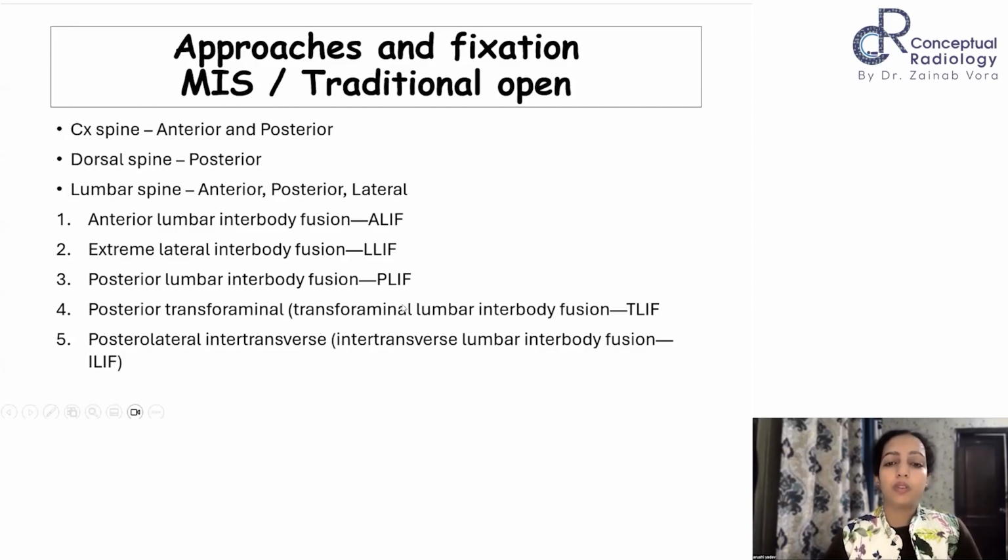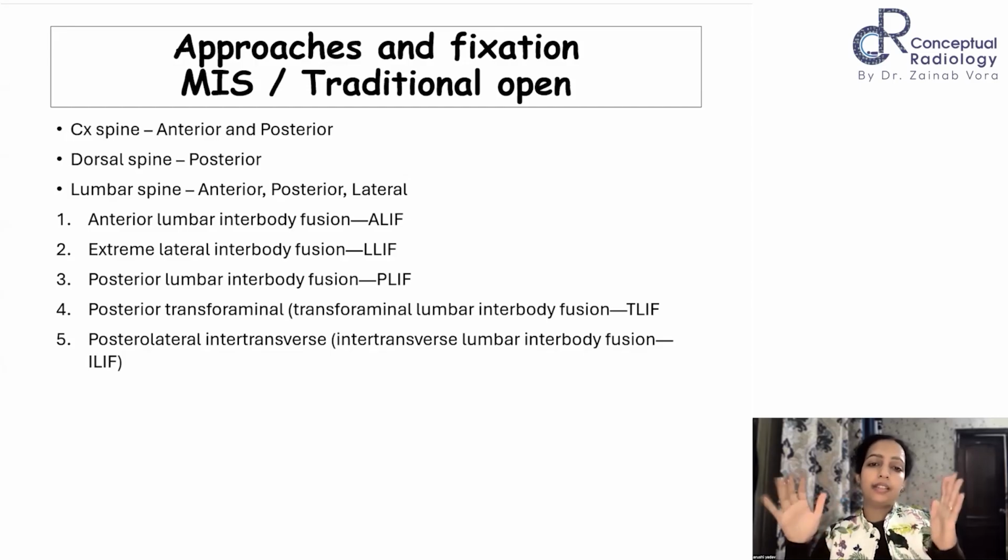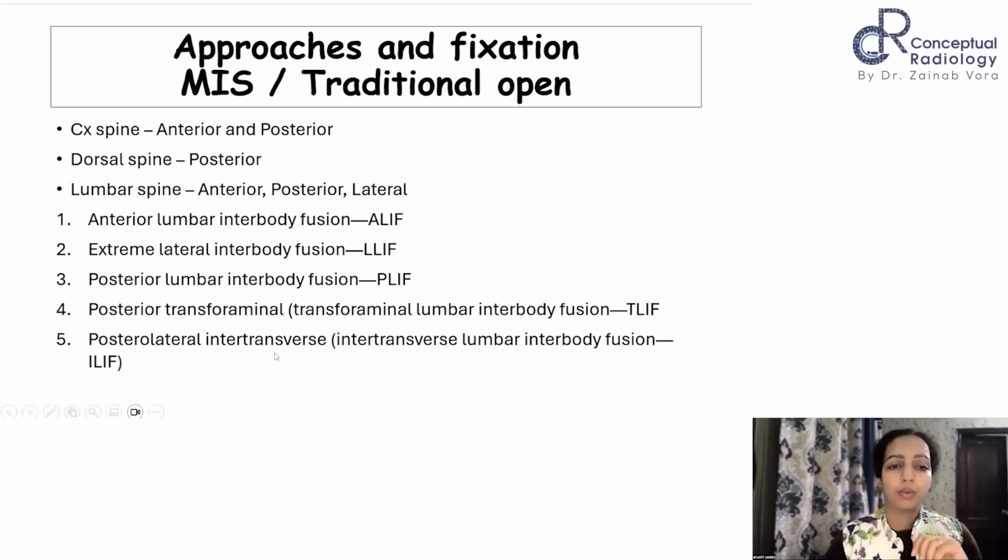And it goes by these names. These are all the names that you encounter. That is anterior lumbar interbody fusion. Interbody means in between the two vertebral bodies. Anterior, why anterior? Because you are approaching anteriorly, from the lower aspect of the abdomen. So it is particularly suitable for L5-S1 approaches, where you can actually retract the lower abdominal vessels, the aorta has already bifurcated, the IVC is yet to form, and at those spaces it is easier to retract. So this is more convenient for the L5-S1 approach.